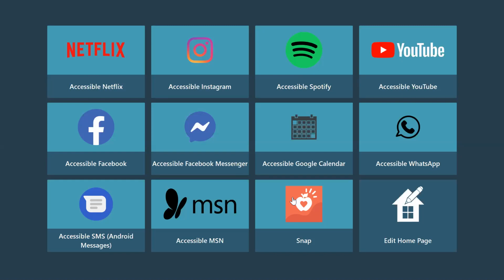So these apps give you a split screen where one half of your screen is the viewing area where you can't select anything, and the other half has your controls. The controls are nice because they're large targets, they're intuitive, and they're easy to understand. They give our eye gaze users a chance to access these same apps, with the same level of control as you would get through your tablet and your iPhone.